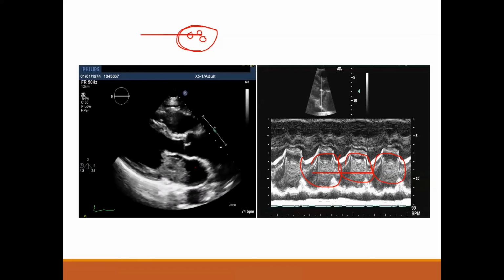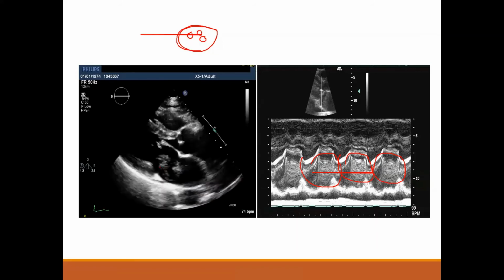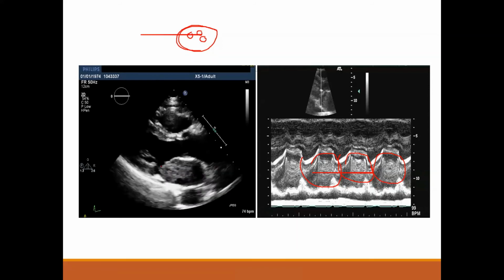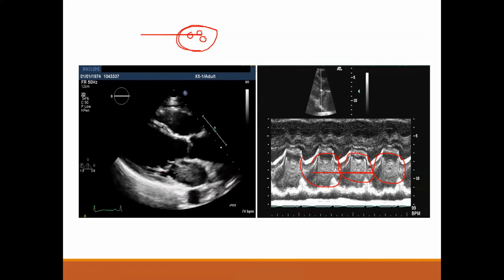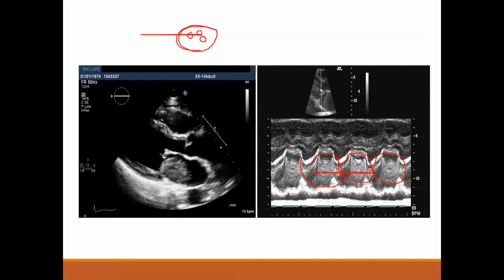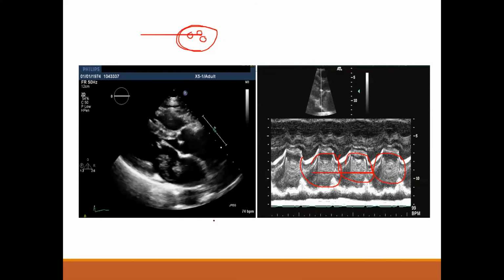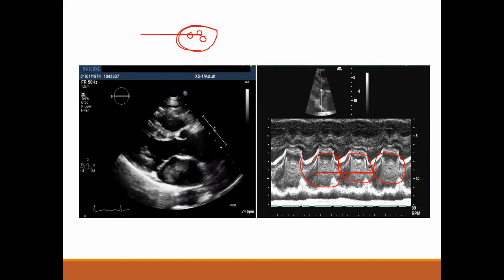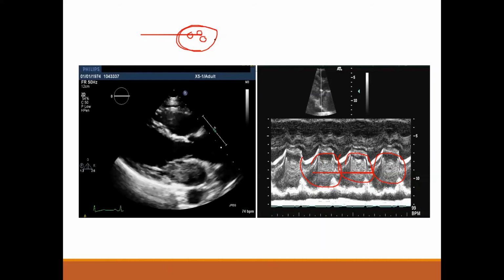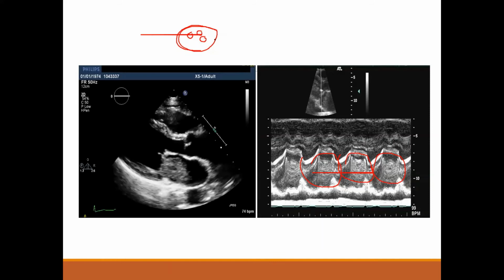So you describe that this mass is irregular. You see, it's irregular, it's mobile, it's coming into the plane of the mitral valve, probably with an obstructive effect, which needs to be clarified by gradients and colors and all of that. Now, there is echolucency, there are echodensities, which are not showing in here, but if there are, you have to describe them. That will be a bonus in your description. Okay.